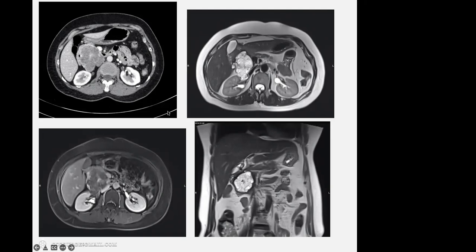In this picture, can you identify any lesion, any abnormality, or is it a normal study? No, sir. I can't hear you, please repeat. Sir, it's not normal. So where is the pathology? Where?